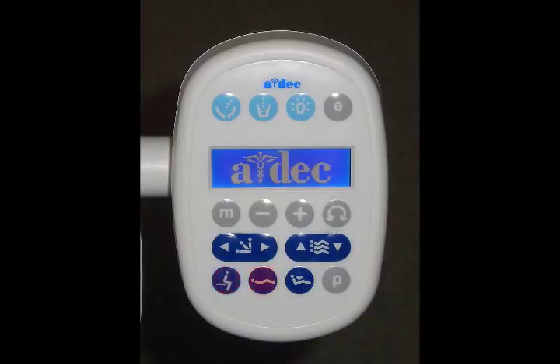This control will lay the patient in a supine or reclined position. This button will set the patient in an upright position, with the base of the chair taller than an exit position. This button with the letter P will allow you to reprogram any of the settings on the programmable control buttons.